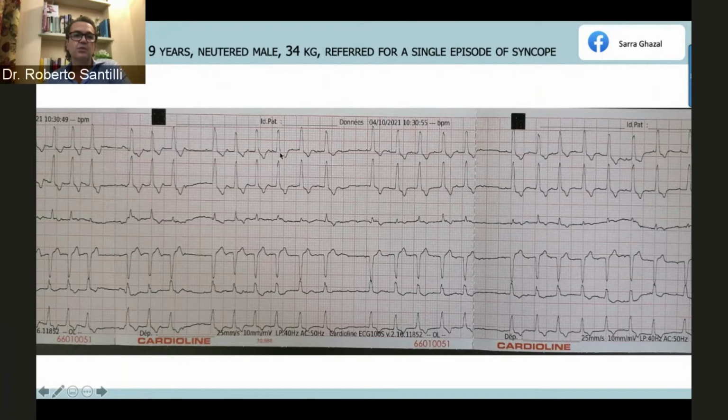Here I can see 2, but obviously it is an artifact because one cannot be so close to another, so it's just one here, and then here what happened? We have different. It looks like atrial activation here, but in my experience, that is probably not true.